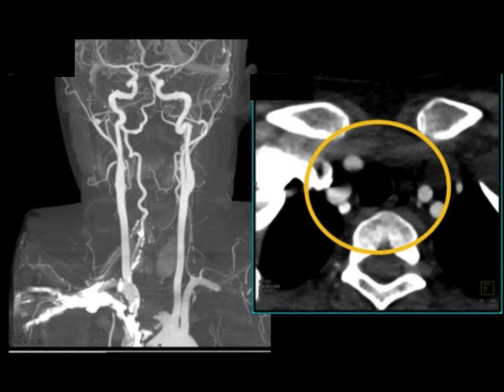Well, if you go back and you say, well, why is it good on this image? Look left to right. Why is there occlusion and no occlusion? What's happening is the very dense contrast that is seen in the patient's axillary regions from a right-sided injection has come across, created beam hardening, and so the vessel tends to be obscured, and so it's felt to be not there. Once you go back and you play around with the editing and you put the vessel back, then the images look good. So, for example, you go from that to these images where you can see the vessels look indeed good.